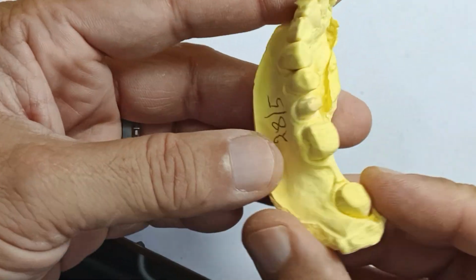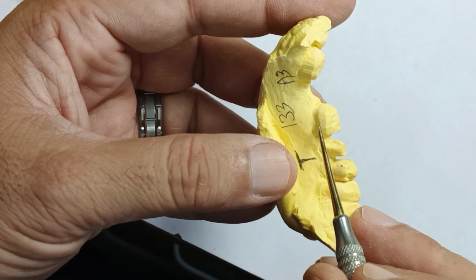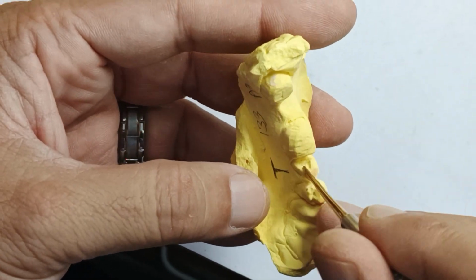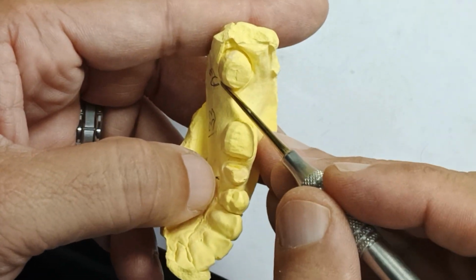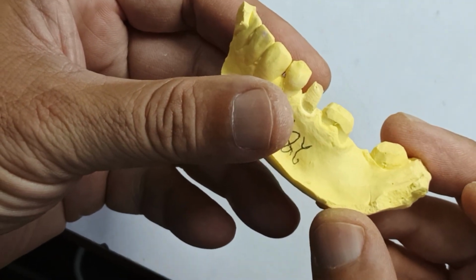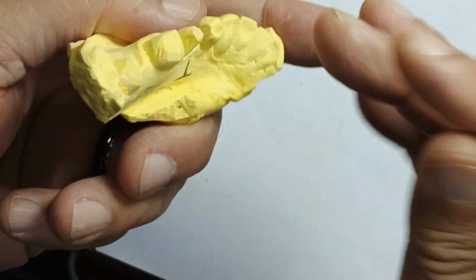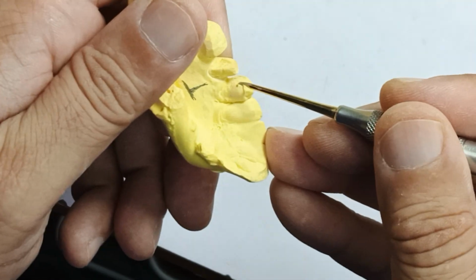Look at this prep. Where is the prep? It sliced through. There's undercut right there. Where is the margin? There is no margin. There is decay or something left because there's a defect on the premolar right there. They don't draw parallel to each other. There's an undercut right here. And this is it. On May 28th it came in. What are we doing, for God's sake? And as they were cutting this tooth, they also cut the adjacent premolar. You see the marks, burr marks? The burr was taken through and you cut the adjacent tooth.